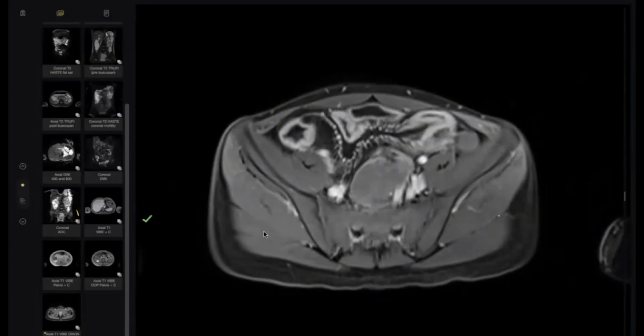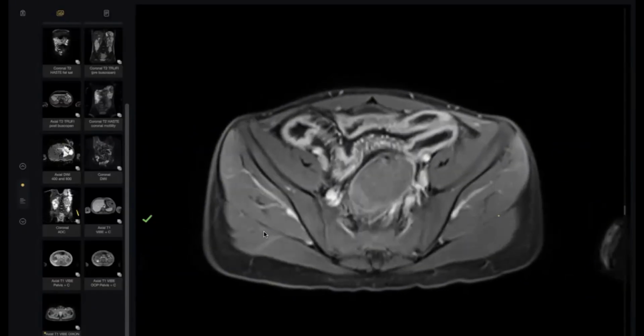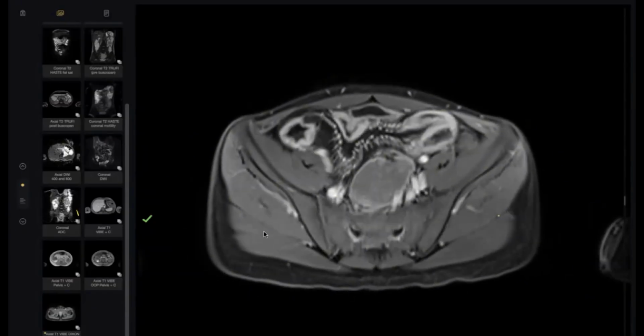What happened here? What is this? I think these are abscess, ulcers. No. See, this is the lumen. This is extraluminal. Featureless lumen?